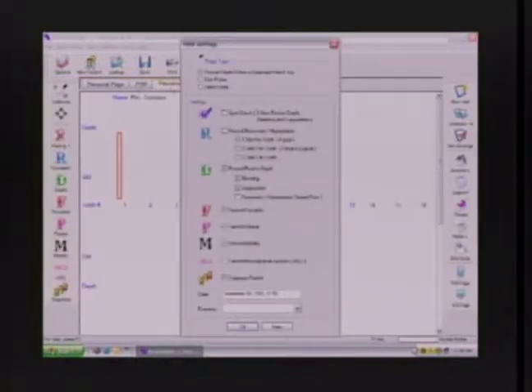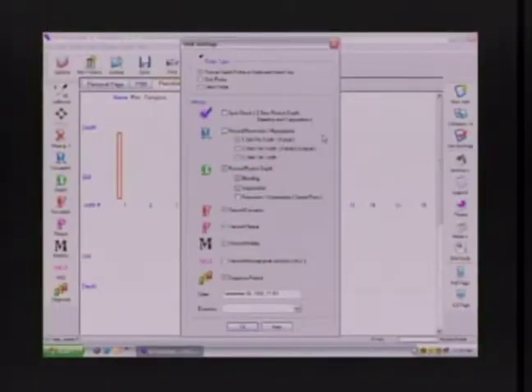When I click on Perio page, it takes me to my visit settings. Think of the visit settings as telling the computer what today's exam is going to include. A comprehensive exam is everything. It's the dentition, recession, hyperplasia, gingival attachment, pocket depth, bleeding, suppuration, furcation, plaque indices, mobility, MGJ involvement, and a diagnosis. I can turn any of those modes on or off by simply selecting or deselecting. I have recession and the MGJ mode turned off for now, and we'll return to them later in the exam.